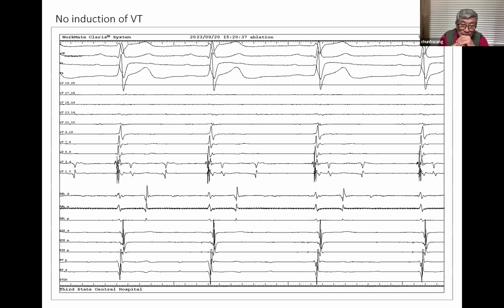Yes, it also shows the polarity reversal. That's systolic, correct, and diastolic. Yes, you're perfectly right. Interesting. Yes. Wow, this is a very unique EGM. Yeah, okay, we can see clearly. So, yes, because you're close to the valve apparatus.